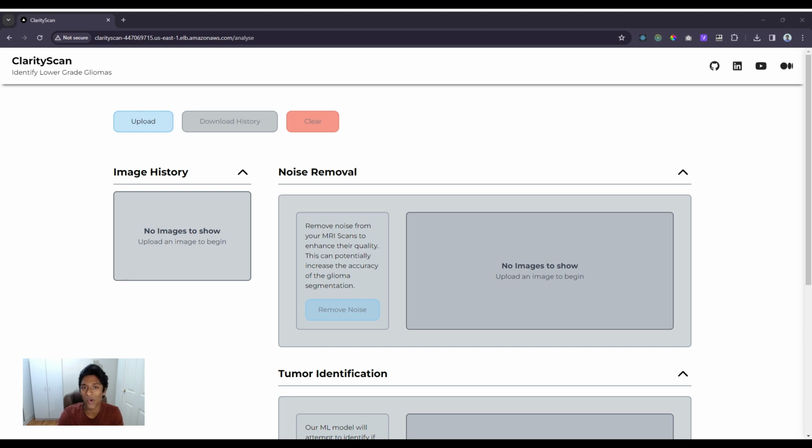And I think that video will be really useful for anyone who's interested in how to build end-to-end deep learning projects, from data preparation to developing the model and all the way to deploying the model and creating this front-end application. And I'll go through all of those steps in the technical walkthrough.